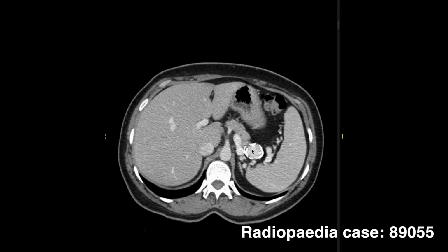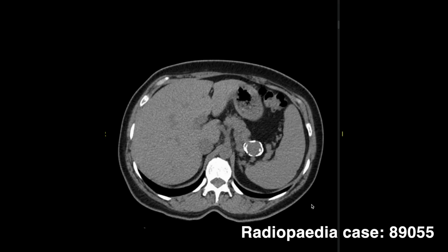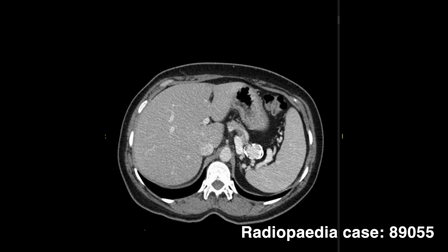It is going to be high. Look at it on the arterial phase. This is the arterial blood, still brightly opacified. On the portal venous phase, a pseudoaneurysm will still enhance strongly because arterial blood persists throughout the contrast window, and that's how we catch it.